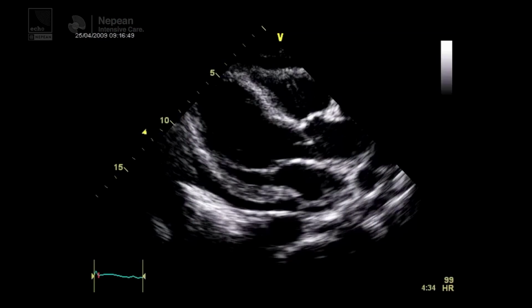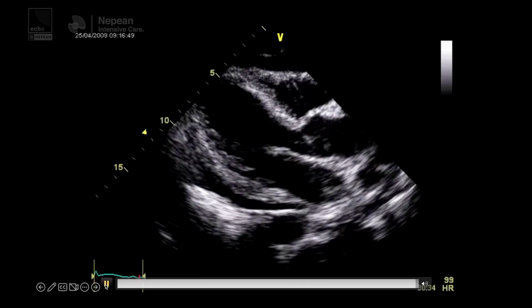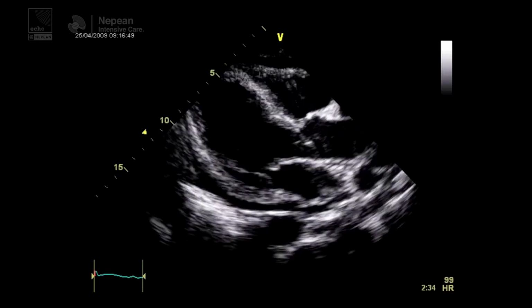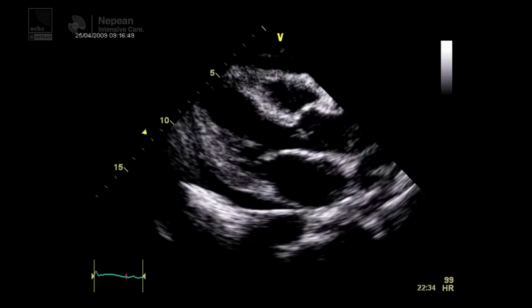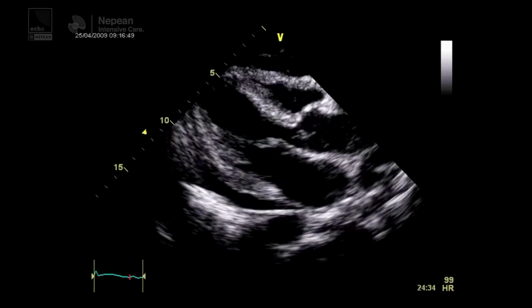I would report, as I said, the size, and then the appearance of the effusion as well. So whether it is echo free, a big dark echo-free fluid around the heart, which is probably the most common form of effusion that we see. But of course you can have echogenic pericardial collections, and in that case you'd be thinking about blood.